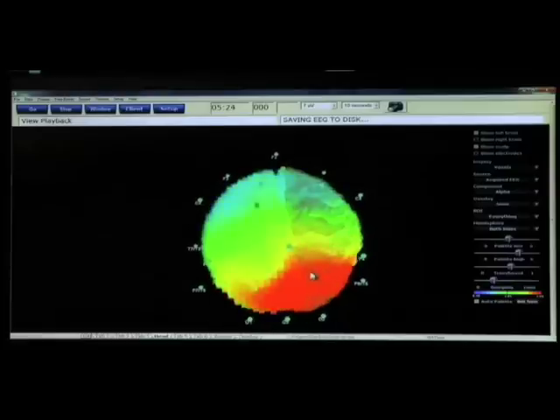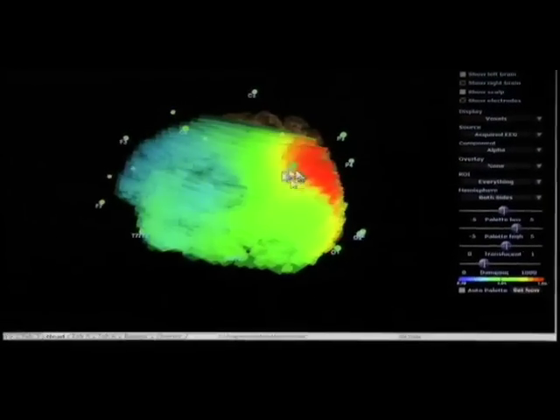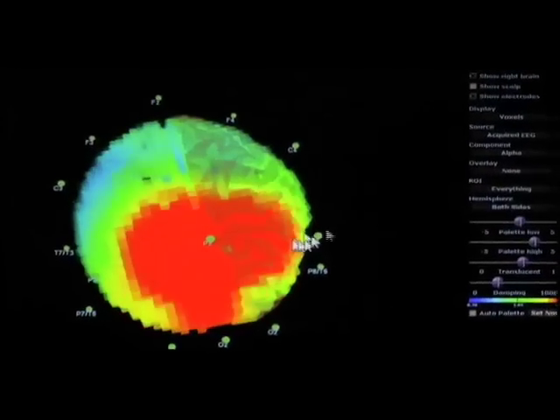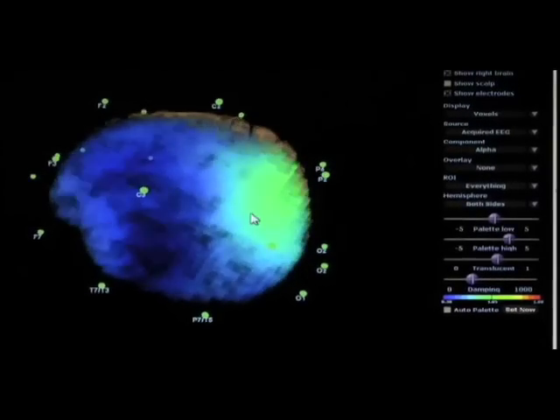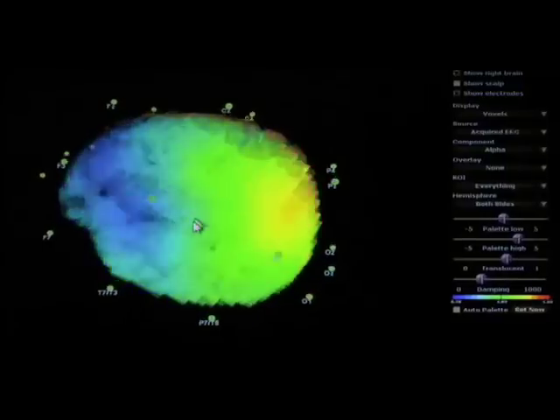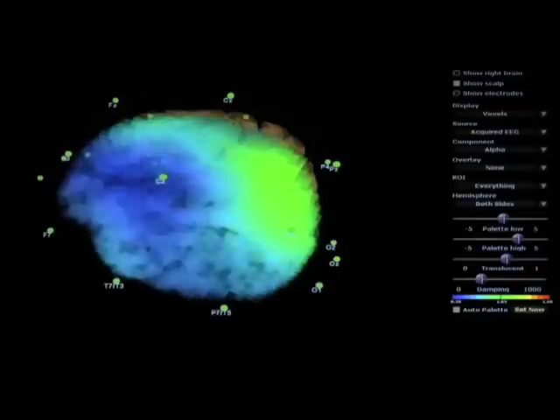There's a posterior dominance. So it would be interesting, in order to train these specifically, to look at the ability to get waveforms and training channels which are related directly to these brain regions, rather than simply to the electrode locations, such as P3 that we see here. P4 is over here. Now, in order to do that, one method we use is called Brodmann localization. And let me briefly show how that works.